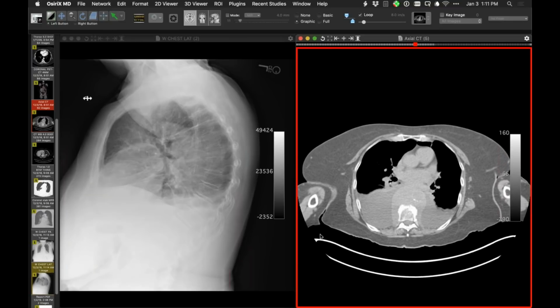But previously we had a pretty crisp posterior wall of descending aorta. Yeah, all the structures one likes to see there: posterior wall of bronchus intermedius, opacity representing just the left pulmonary artery, and what you described, all of those things are present there. There's just far too much opacity present there, effacing the usual interfaces one would like to see there. Exactly.